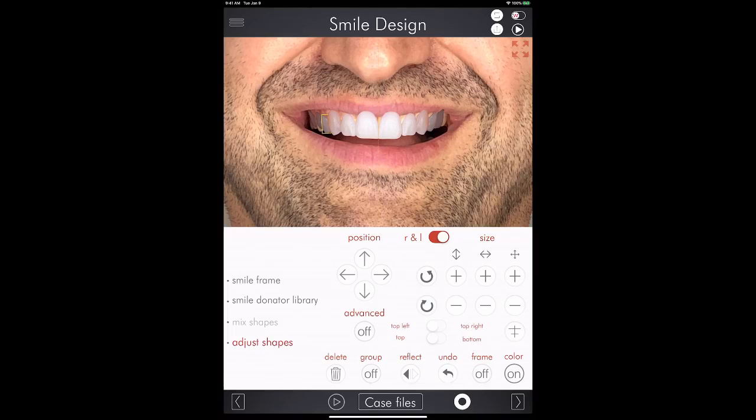The light, flashes, and all the stuff. Now we need to adjust the colors of the design to the picture, because the smile needs to look good in the picture, right? That's why we're going to increase the brightness. We're going to add some warmth to these premolars and molars, and we're going to make sure that the result is looking good.